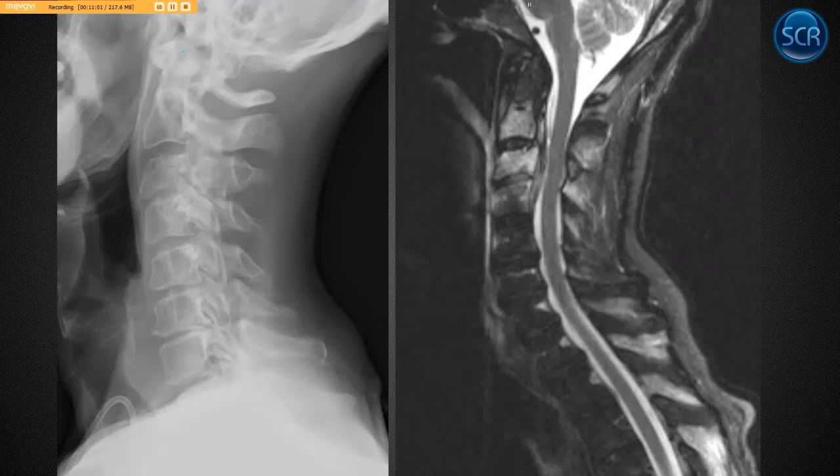All right, so let's look at this case. We got a normal ADI up here. Upper cervical spine looks good. Good space up here. No block vertebra. Follow this line down, and everything looks lined up except we don't see George's line right here. So you draw this line down, and you're like, wait, what's going on here? We got a line here, we got a line here.